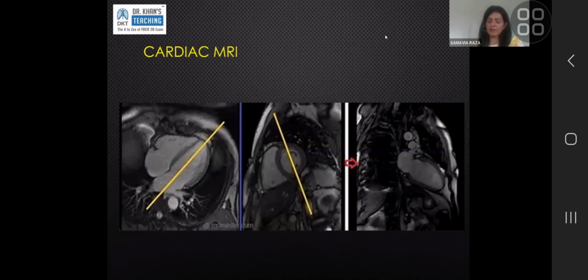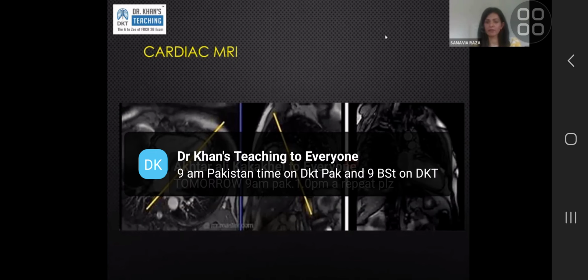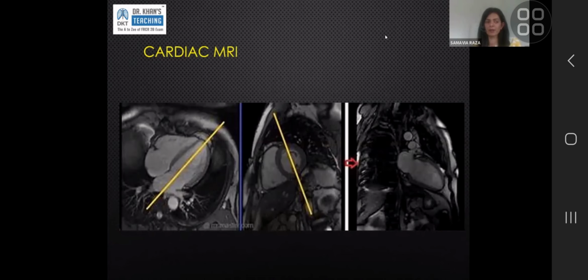So cardiac MR is different from cardiac CT in the sense that cardiac MR is a dedicated cardiac scan. A cardiac CT is essentially a body CT looking at cardiac structures, which you have to reconstruct later on. Cardiac MR is acquiring images of the heart. It makes sure it is going by the axis of the heart. It doesn't care what the body around it looks like.